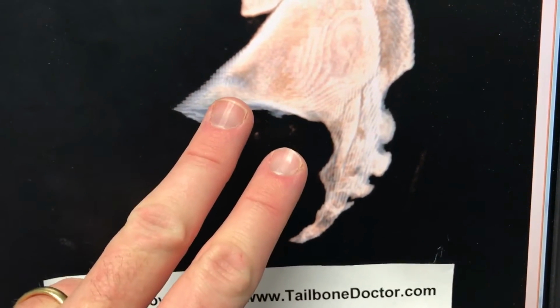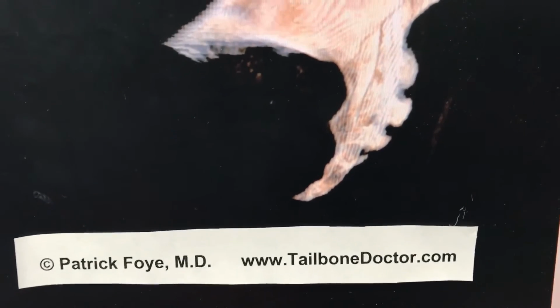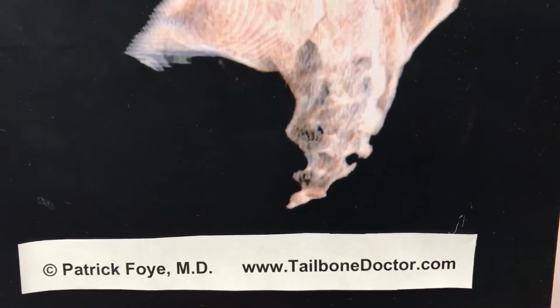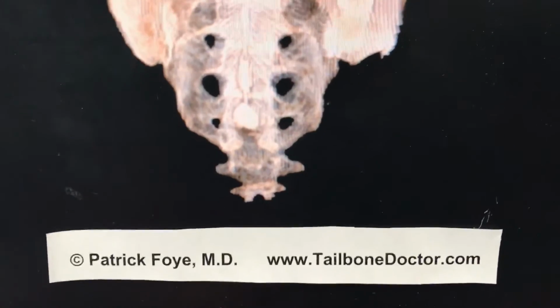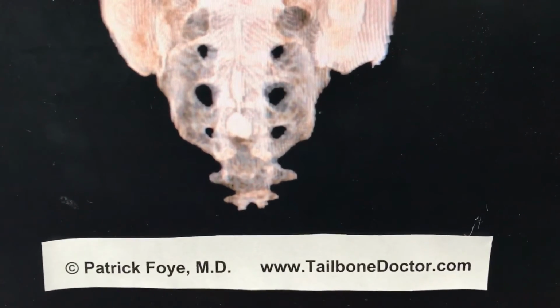Whereas being able to rotate brings it out to where you can see the two. So the same type of thing here. It looks like just one solid lower part of the tailbone, but being able to rotate it, now we can see that there's actually two prongs or portions coming down.